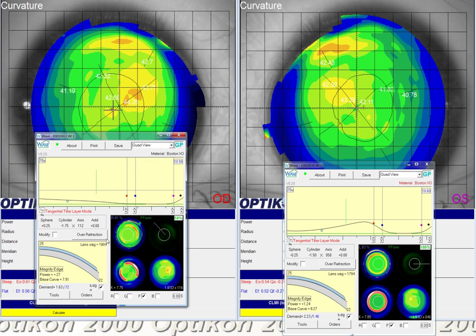So if we're about a quarter here, then here we want to be between 3 and 3 1/4. So I'm going to increase our topo demand here. And same thing here.